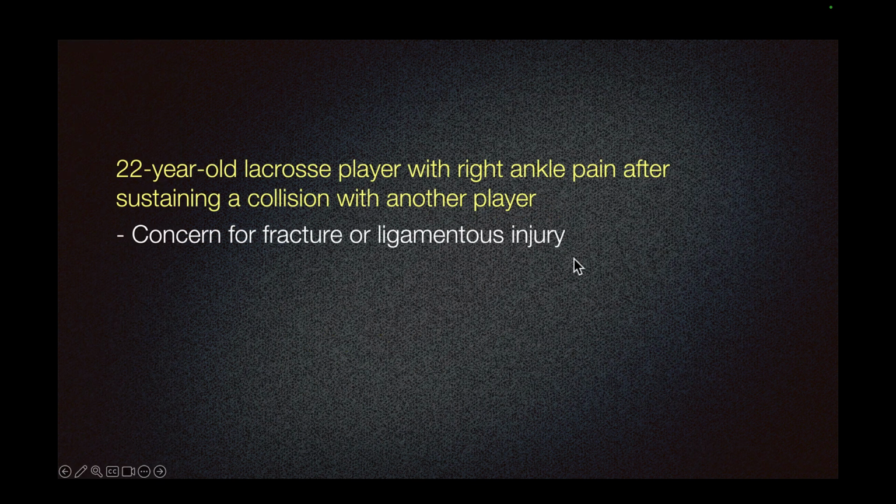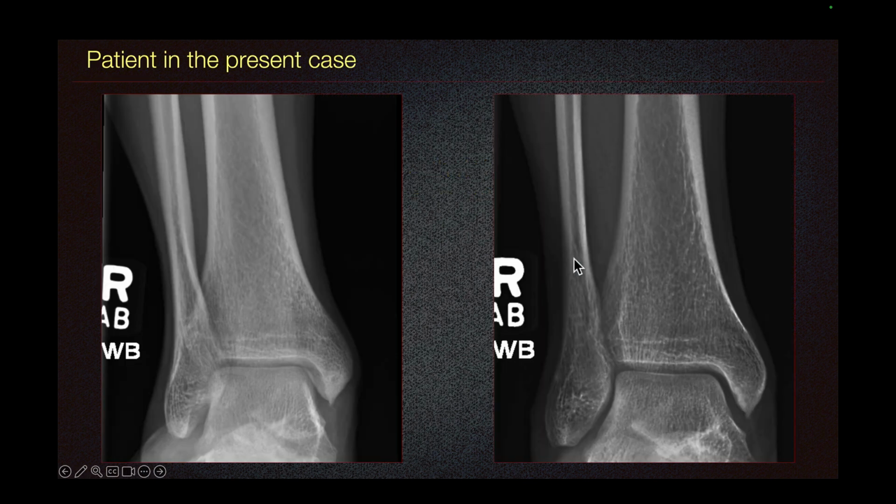We have a case of a 22-year-old lacrosse player with right ankle pain after collision with another player during a game. These are radiographs from the patient. This is frontal view and this is Mortise view.